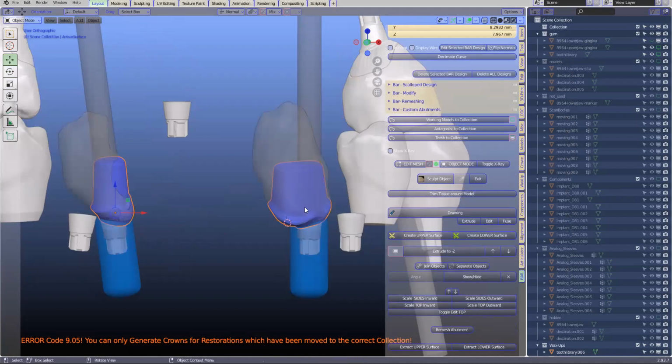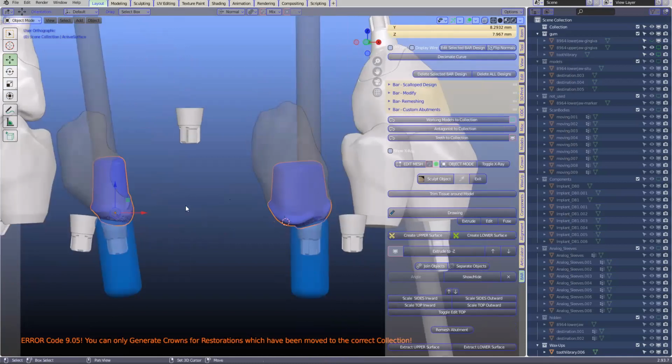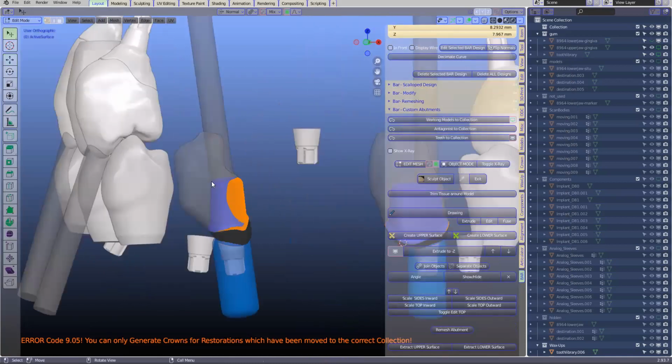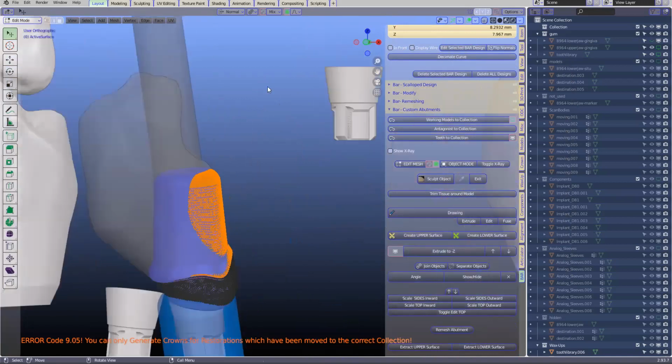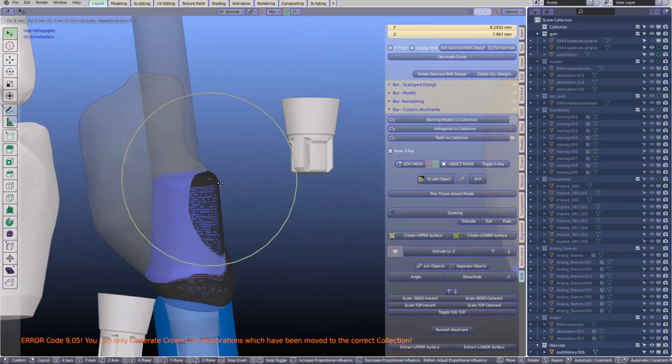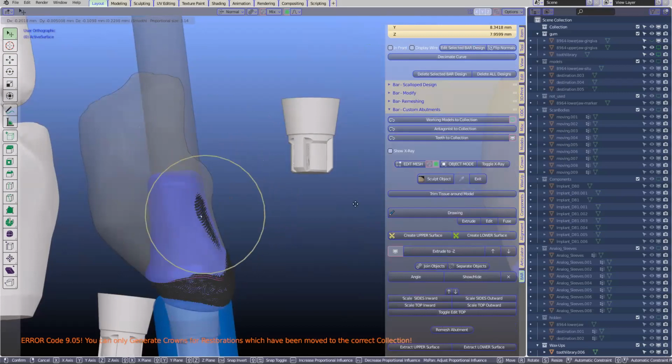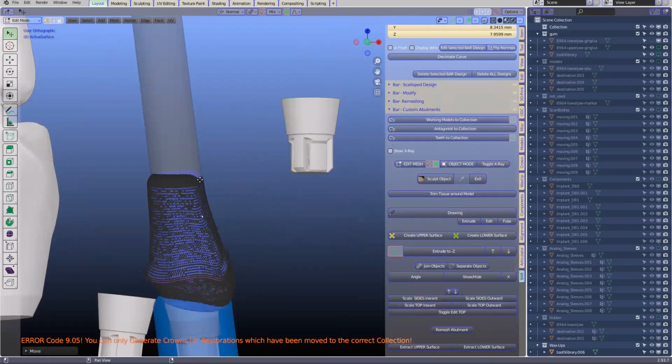Okay, yeah, you're 100% right. So what we can do still is move things inwards if you wanted to. You can take this and move this inwards a little bit, you see? So we don't end up with a super thick crown. Yeah, that's what I was thinking.